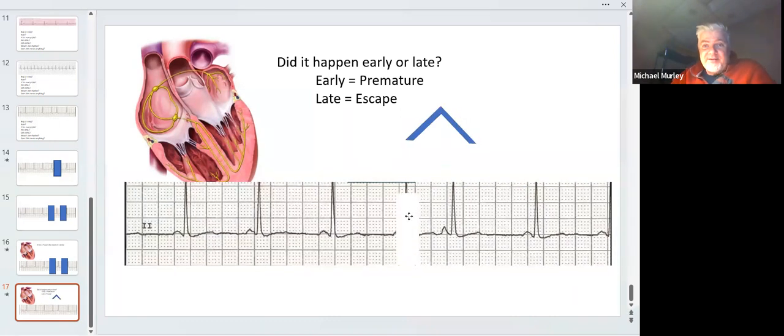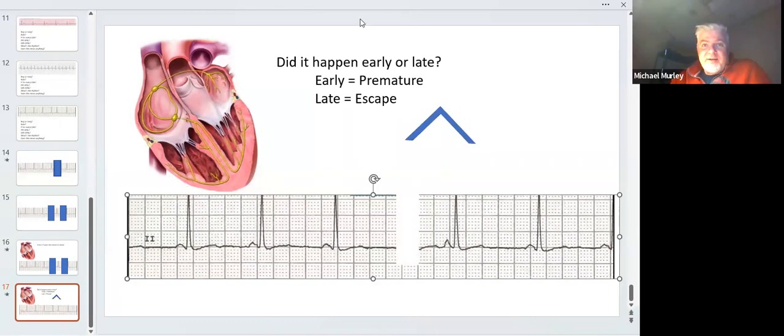So let me draw this thing again. Let me draw another annotation. I didn't mean to go over these, but might as well go over it. Oops, that's not what I'm looking for. There we go. We'll say we're missing two complexes, and this line just keeps on going. Oh, that's not the right one. Oh, that's crazy looking. I'm trying so hard to draw a straight line.